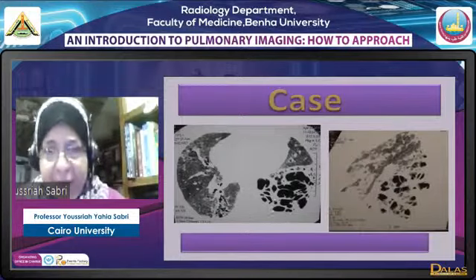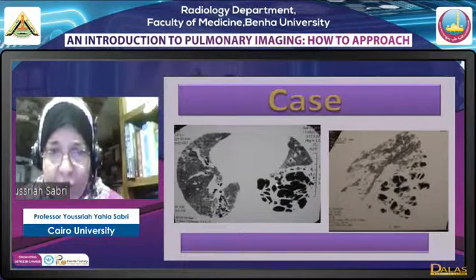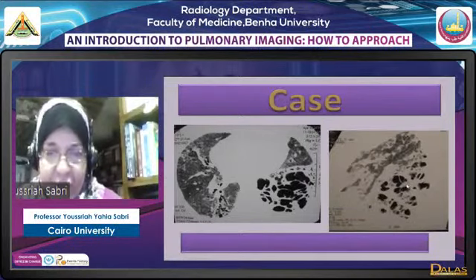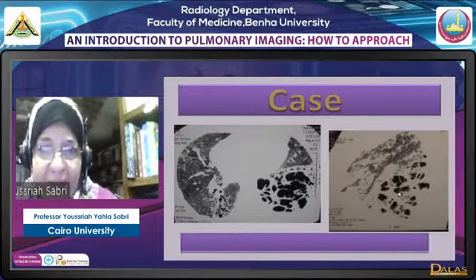Now we have a similar appearance here, multiple what looks like cystic, a bizarre shaped cystic lesion together with opacities in between. But here we have shift of the mediastinum, of the fissure. There is mass effect here. The fissure is displaced by the lesion. This lesion actually could be lobar, and in this case, it could be segmental, it could be subsegmental, it could affect the whole lung.